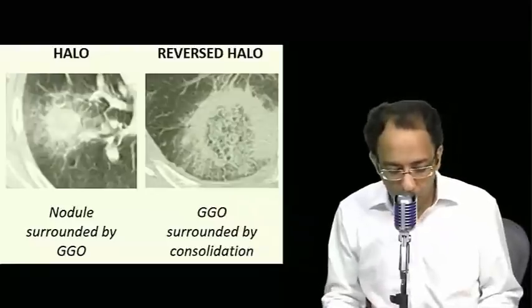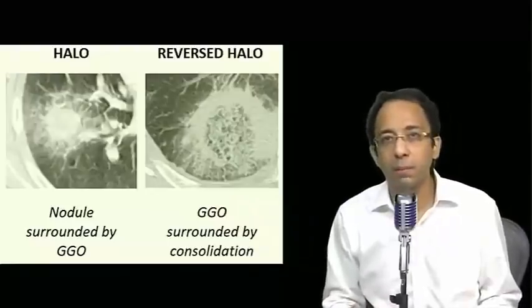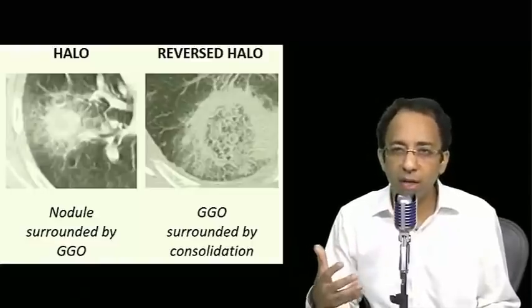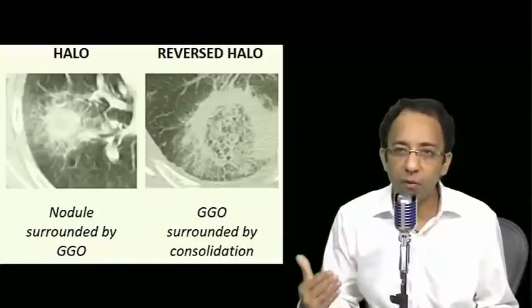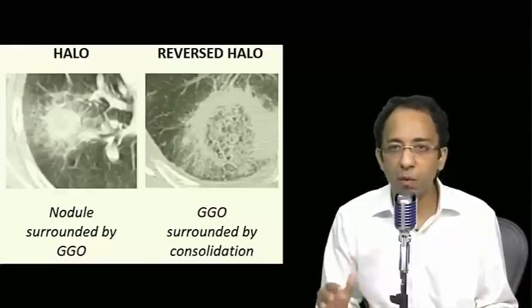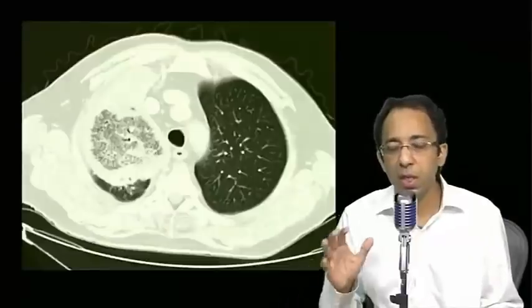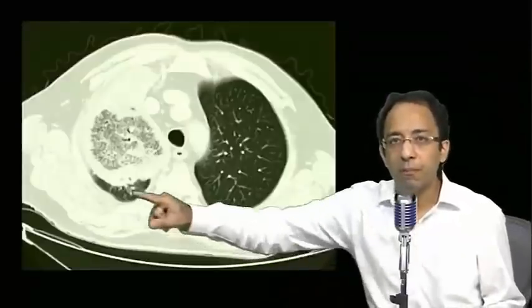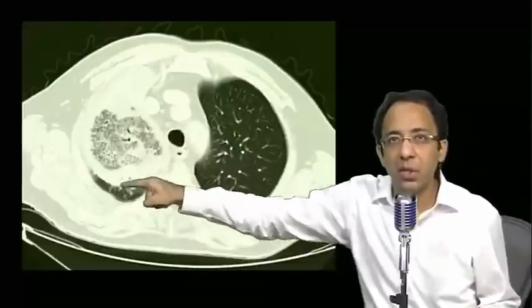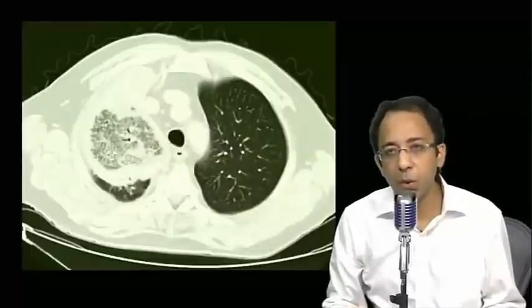I'll tell you the key words to remember here. So the role of radiology here is to point out what radiological findings are more in favor of pulmonary mucormycosis versus pulmonary invasive aspergillosis. Let's try to understand. I'll show you. Please see. This is the reversed halo sign. The central ground glass and a thick peripheral consolidation, which is more nodular, more irregular as compared to what we see in cryptogenic organizing pneumonia.